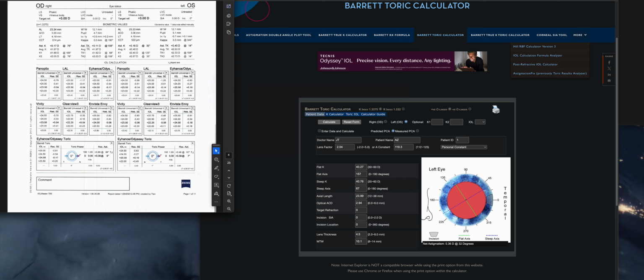And so for folks who know how I set this up, my TN mode here, forget where that's labeled, and TN LVC modes are very different. This is done under TN mode, which is for virgin corneas, and TN LVC is my post LASIK, post PRK, SMILE configurations, which utilize the TK.